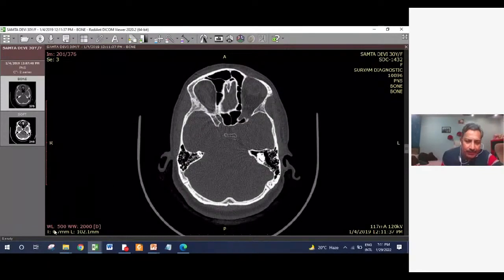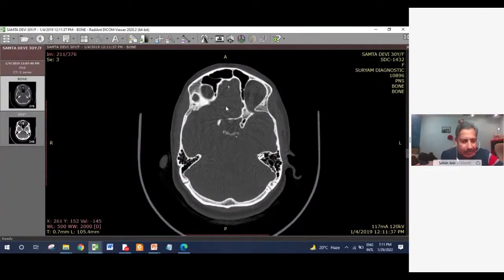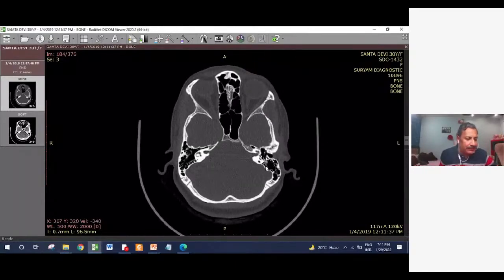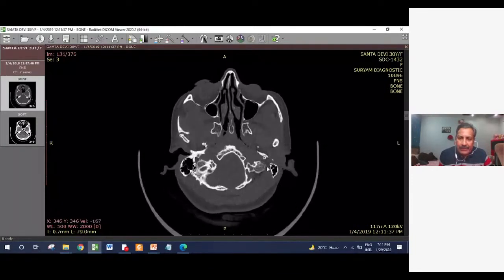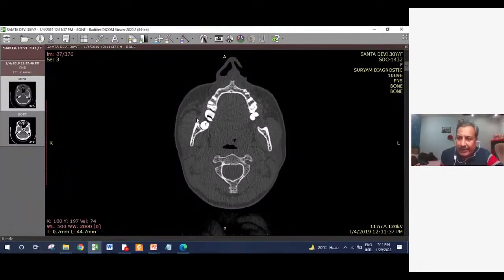Thank you for informing. So you see this 0.7 mm scan shot in the axial plane. The CT scan for the paranasal sinuses is shot in the axial plane. And how many slices do you have? 376. So right from the top of the head to below the floor of the maxillary sinus, I am getting the CT scan in the axial plane with 376 slices. Are you getting it now?